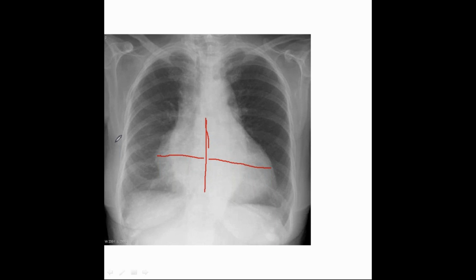No, it is not a boot-shaped heart. We have an X-ray of that. So from this alone, aortic aneurysm, no. For this X-ray, what I would say is that A and B is fine. In C you will see that there is cardiomegaly. MS could be a possibility. Yes, it could be cardiomyopathy.